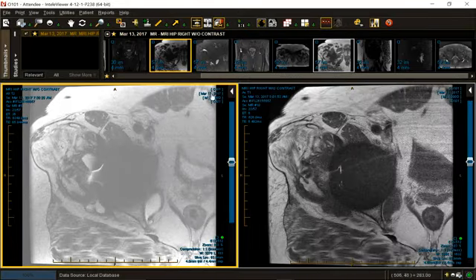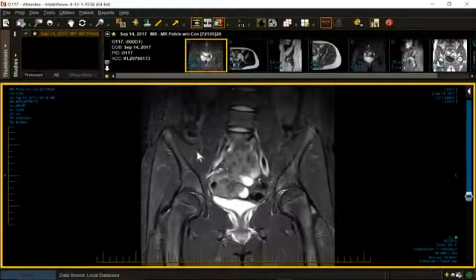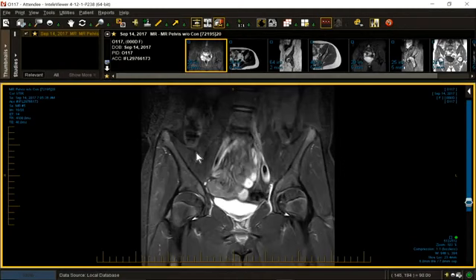By the way, the patient has rectus diastasis. Let's look at one more. Probably going to do a little more hip tomorrow, just to start out, because hip is the most difficult joint. And I brought a lot of interesting cases to show you. In fact, I brought a lot of interesting cases for every body part. I'm a little overexcited about it, but that's a good thing. And I'd like to try and make a difference.